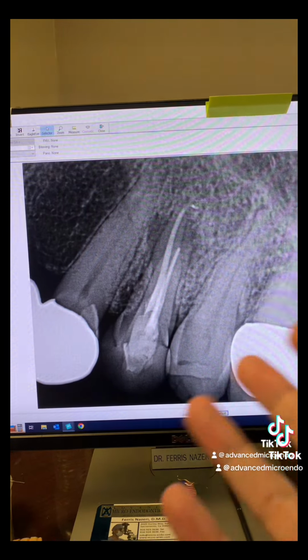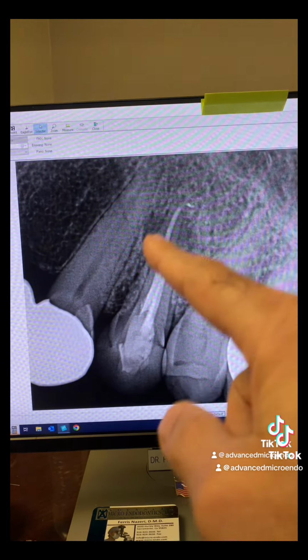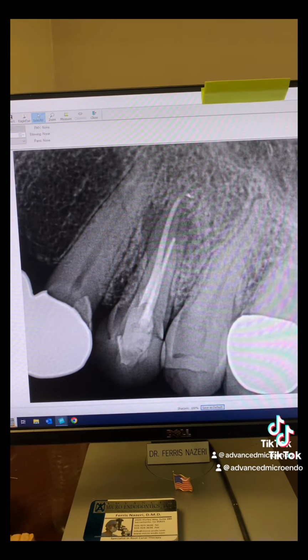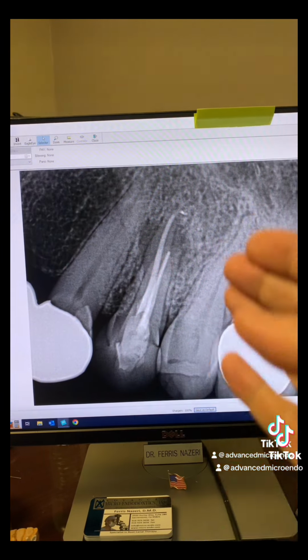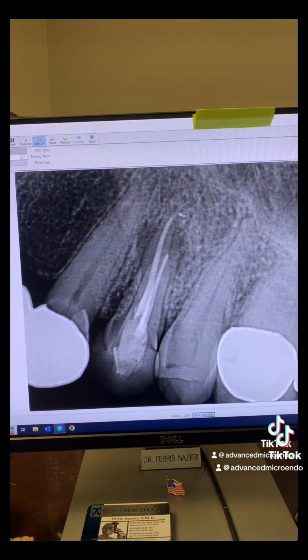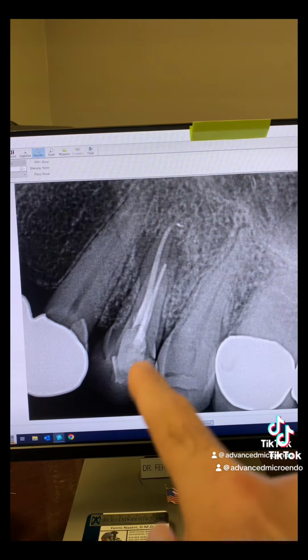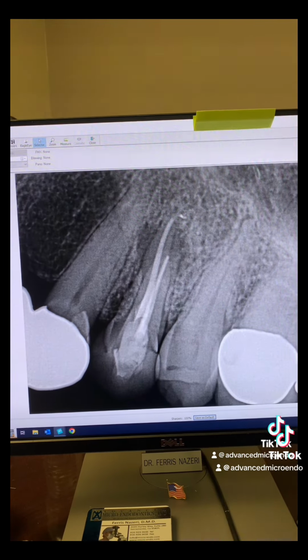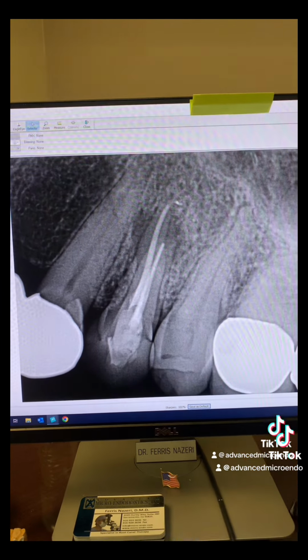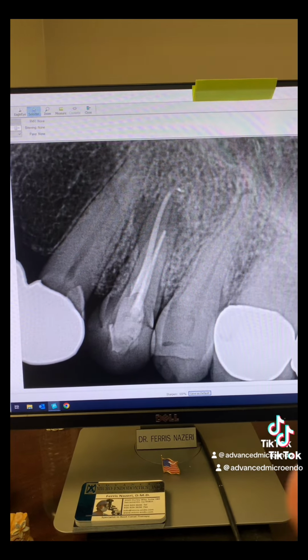We told the patient this tooth has a hopeless prognosis. Don't spend a penny on it because of the fact that the root is fractured. Contact your dentist today and have your dentist arrange for the extraction of tooth number 12, and hopefully the patient will go with a dental implant here. So all the money that she was going to waste on having the root canal redone, tooth rebuilt and recrowned, all that money now, because we diagnosed properly, she will spend towards extraction and getting a dental implant there. All right, so that's what you need to do.